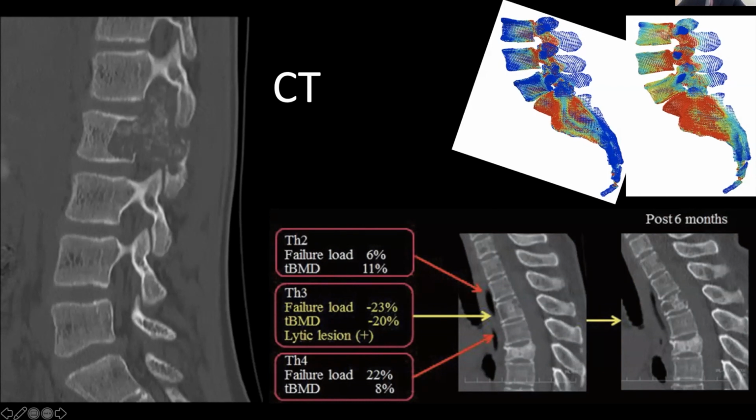What I wanted to show you here is that we can also take the data from the CT and use it for some very useful applications. We can do what's known as finite element modeling, which you may be aware of, which allows us to, for example, compare population data with an individual's data and look at things like stress-strain relationships across end plates. And there are various software algorithms that are becoming more and more available in assisting your ability to decide various characteristics of pathology.